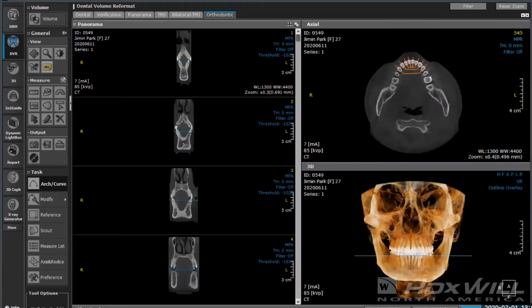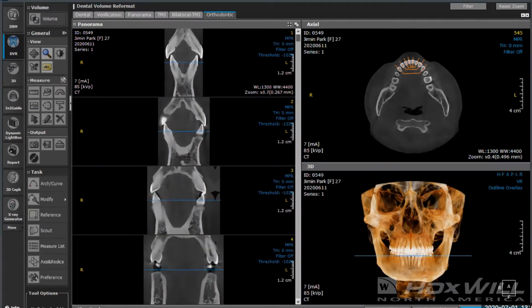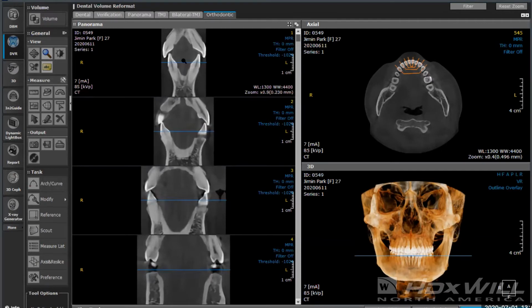Now what that allows us to do is that we can see each one of those lines to be able to see that arch just with those teeth and how they interact. So in this case, I'll go ahead and blow these up so we can see it a little bit better. And you can see that now we can see how each individual tooth bilaterally interacts in occlusion. So we can be able to make an analysis as to if there's some place that doesn't occlude as well as others, or how it occludes bilaterally, that we could actually start to make this analysis.